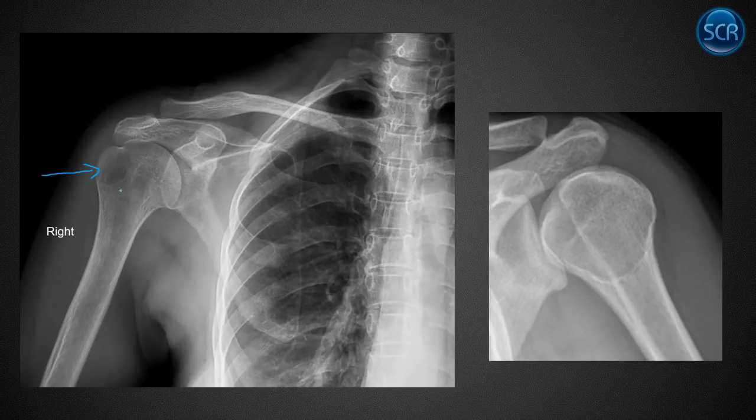It's a known kind of fake out. On this one, people could be mistaken that there's a lesion here too. So this is just where the humeral head attaches to the humeral neck. So it creates this border, makes it look like this whole thing's one big lesion, but that's just normal.